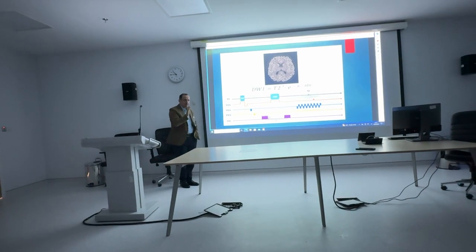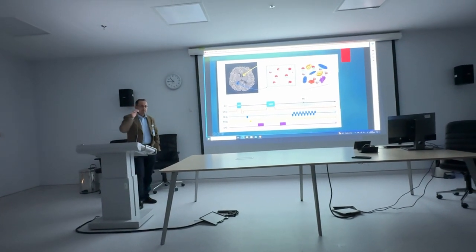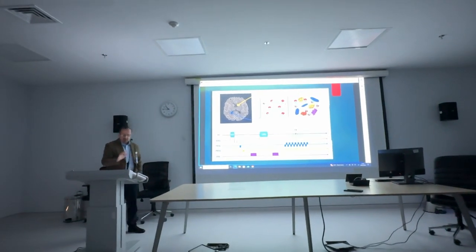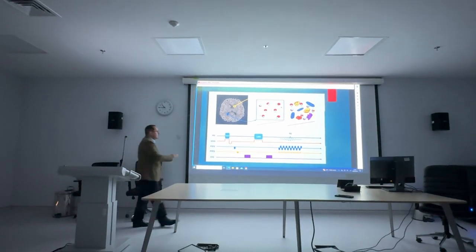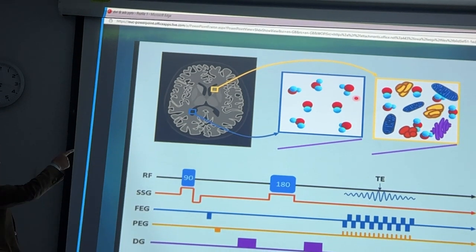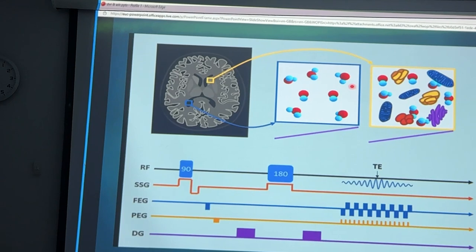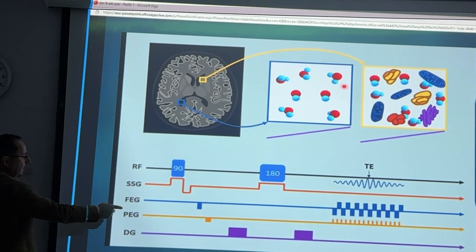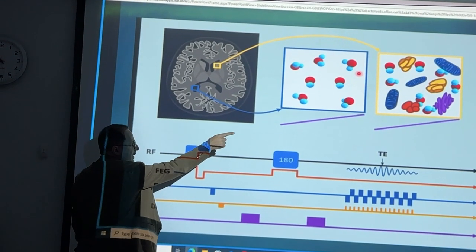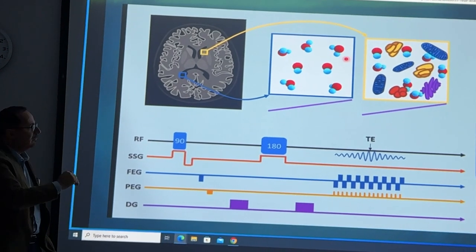What will happen if we are talking about two types of tissues? The free diffusion tissue and the restricted tissue. The free movement tissue is represented by this first image adjacent to the diffusion weighted images, we apply the first gradient. This is the first gradient, and this is the first direction of gradient, as you remember, and we can manipulate the gradient in direction and orientation.